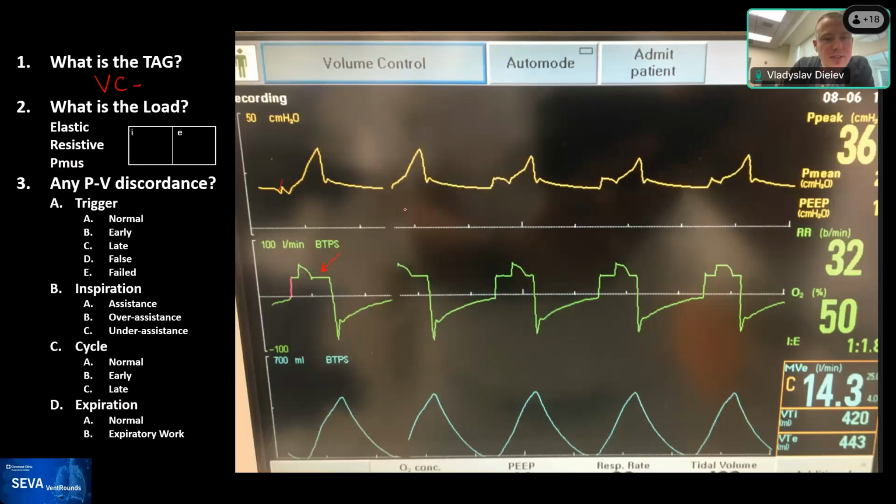So for that, we need to understand how the patient behaves when a patient-triggered breath and a machine-triggered breath occur. We already evaluated the patient-triggered breath, so we can skip the second breath and move on to the third one, which appears to be machine-triggered. Again, it starts with a flow. It looks like the flow delivery goes on, and then there is a positive more flow for a little bit of time, and then we go back to the baseline flow, and then the breath is cycled. So again, it appears very similar to our original breath.